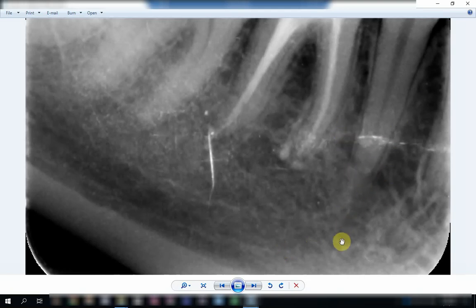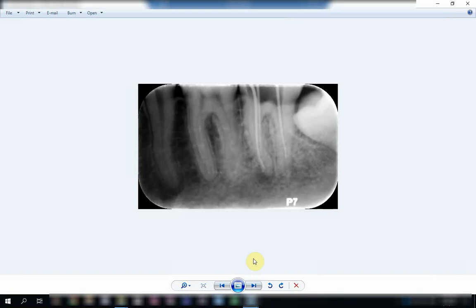Here the level of the mental foramen actually is at the apical third of the tooth. As we have seen from the OPG, sometimes you see it over here. It depends on the anatomical variation, and it depends on how the radiograph was taken, I mean, from a geometrical point of view. Short radiographs will give you the impression that the mental foramen is high, while elongated radiographs will give the impression that the mental foramen is closer to the inferior border of the mandible.